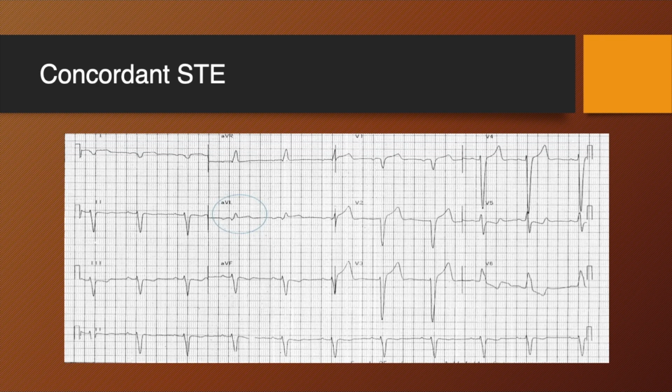All right, so here is an ECG of a patient with a bundle branch block, and specifically a left bundle branch block. And so you can see that you have a wide QRS complex, right? You've got P waves, so this is a sinus rhythm. So a sinus rhythm with a wide QRS complex might be a bundle branch block, and then we can easily look at lead V1 and do what's called the turn signal criteria. So if you have a wide QRS complex and it deflects downward, think of that as like a turn signal.